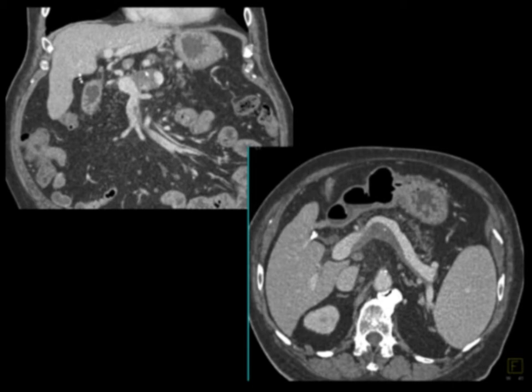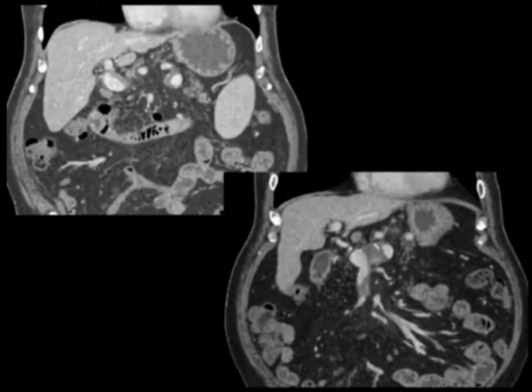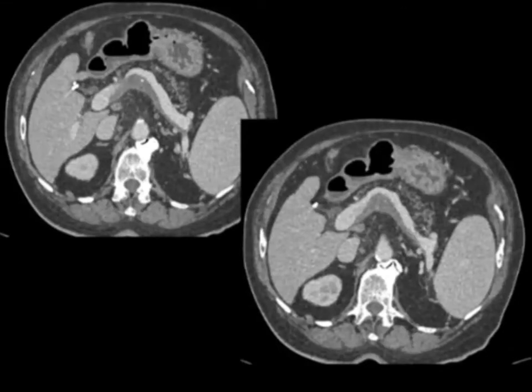And here's just a nice example of what probably was a chronic thrombus. You can see faint calcification in both portal vein and splenic vein, and a little bit down to the SMV. Coronal views are very helpful for tracking the vessel. I find coronals and MIP particularly helpful in determining the extent of the involvement. And you can see it here as I go through a bunch of images.